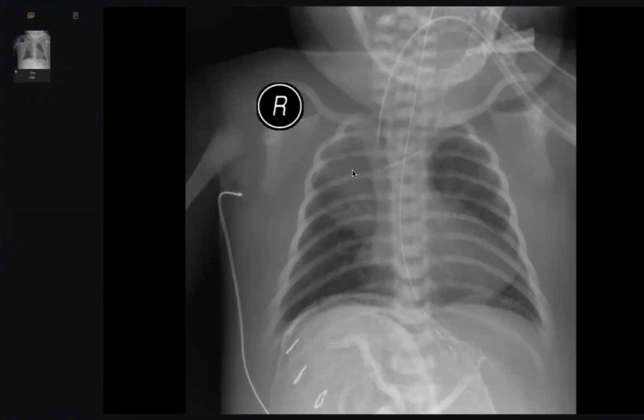Also the lung volume apparently is normal, no plethora. What's your diagnosis? Tetralogy of Fallot. What is tetralogy of Fallot? Tell me the components. It's a spectrum of four to five things in which there's a large VSD and overriding aorta, and what else? Sir, ASD also sometimes related.